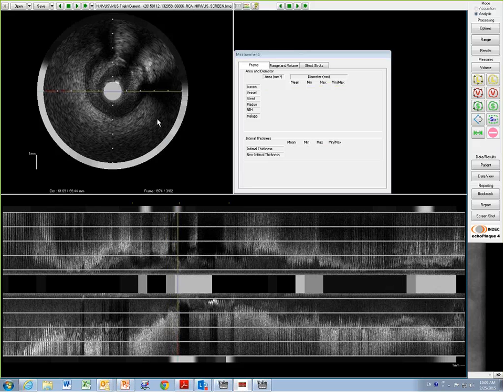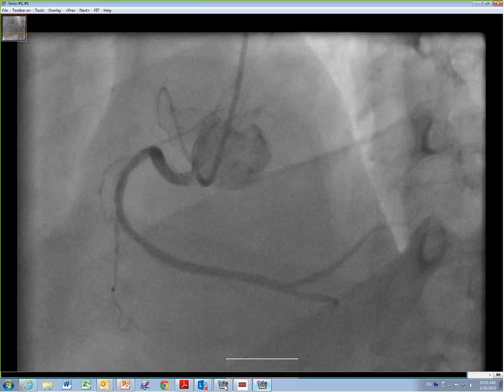I can tell you another thing. After our last meeting, you recommended I start from the proximal and go distal, and I've started to do that. It's much easier to interpret the IVUS after doing that. Yeah, definitely, it's much easier. Okay, so this case, I think this is my only issue. The LAD and circumflex were good, so I'm not saying any more for this case.